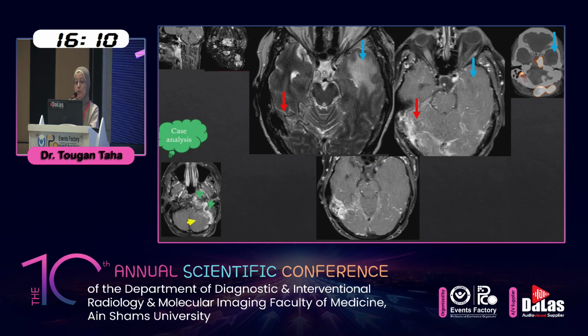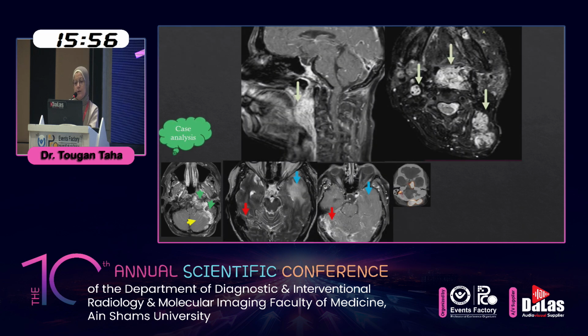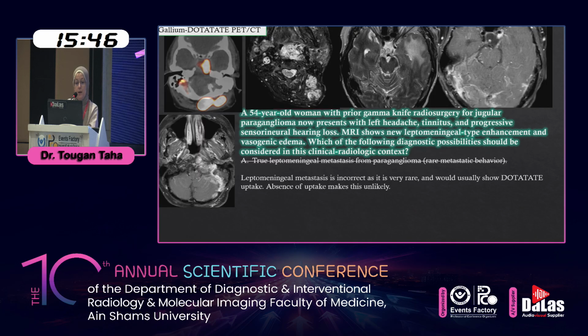In the left temporal lobe, there is vasogenic edema in T2, no underlying contrast enhancement, and no gallium dotatate uptake. Other images for the patient show other similar lesions in the oropharynx, in the left paravertebral, and in the carotid spaces. So back to our choices.